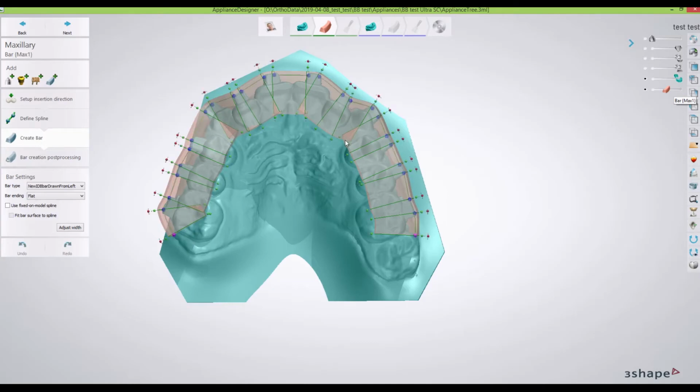You notice where it looks darker? That's where those two layers are overlapping, and if you leave those there and print them, what you'll see is a little spiky part sticking up in your tray. If you see it, don't panic. You can always just cut it out, but the easiest way is to eliminate them from the beginning. So if I go in, and you can see how these will rotate and get rid of that part where the trays kind of overlapped each other.